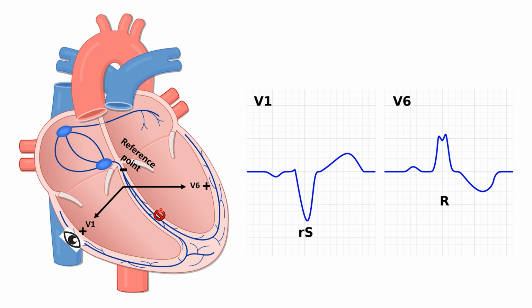Okay, so what we have is relatively faster depolarization of the right side of the heart, represented by these three arrows here. Okay, and we're going to have our dominant S wave in V1. Okay, on here it's an RS complex, but this is our dominant S wave.